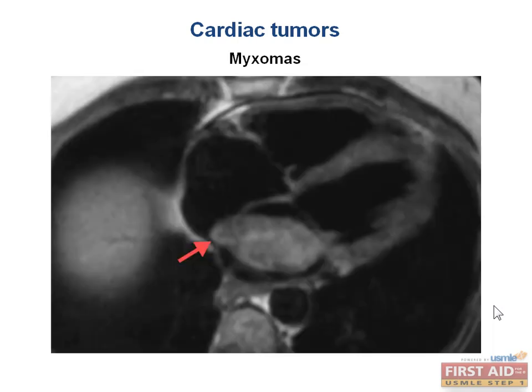Now let's get to cardiac tumors. So let's first start by looking at this MRI. When you're shown an image on your exam, do not freak out. Take a time for yourself, take a second, and orient yourself with the image.